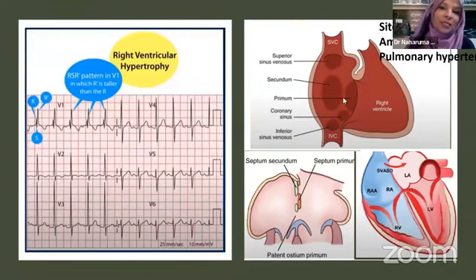And the severity of the pulmonary disease, how can it be classified? By the RSR pattern. Initially there is RV volume overload and progressively the pulmonary pressure increases. And when there is severe pulmonary hypertension, the RSR becomes monophasic R or RVH strain pattern. So this RBBB pattern and RV morphology of V1 tells us the severity of the ASD.